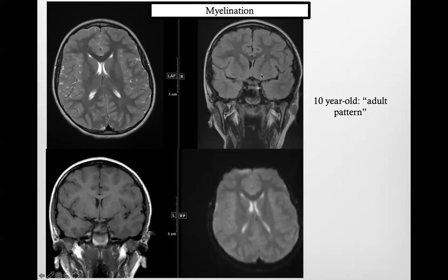This sequence is a coronal like the T1, but it's actually a FLAIR. You can see that the appearance of the white matter and the gray matter are extremely similar to the T2, but we artificially suppressed the signal of the liquor. So basically, the FLAIR is like a T2 where we artificially suppressed the signal of the liquid. This is not a very beautiful sequence to look at. It's a bit more blurred, but this is a gradient, which will be a very powerful tool.